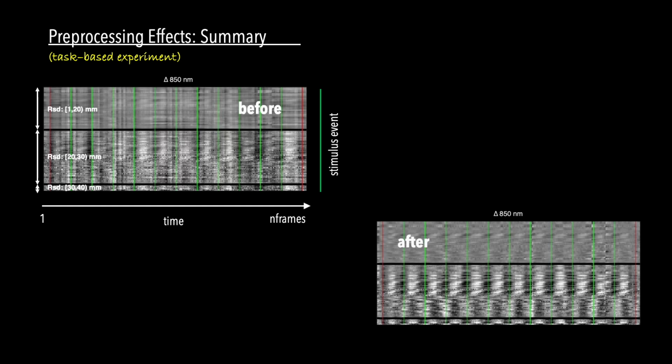These results are summarized using a carpet or power plot developed for functional MRI, in which time series data are converted to a grayscale value and displayed as an image. The rows are organized by increasing source detector separation distance. The plots at upper left and lower right show the data before and after preprocessing.